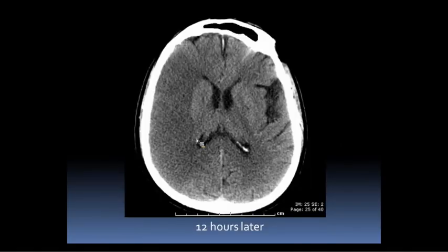So here, this is the same patient 12 hours later, and you can see that it's progressed to an entire large territory MCA infarct. And what we're looking at here is, of course, hypodensity, so edema, loss of gray white matter differentiation. You have complete loss of the sulci over here. So we have the sylvian fissure on the other side. We have several sulci here that we can see on this image, losing all of that. And then as this progresses, we'll start to get further mass effect, effacement of the ventricle, things like that.